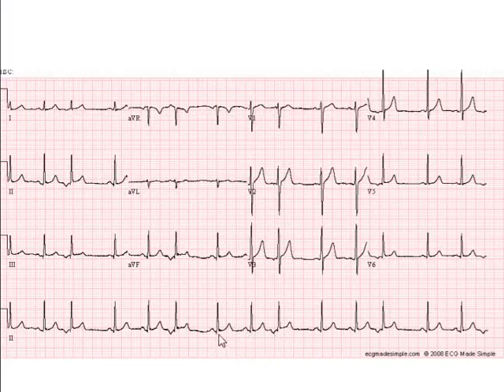The positive P wave is also positive in leads 2 and AVF and lead 1, suggesting that the P waves originate from the sinus node. The negative P wave is early or premature and is negative in all the inferior leads, suggesting that it originates from the lower part of the atrium. That is why these P waves are also positive in the superior leads, AVR and AVL. When premature beats occur every third beat, as in this case, we call this a pattern of atrial trigeminy.